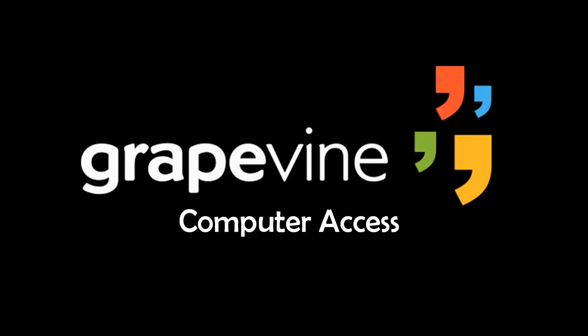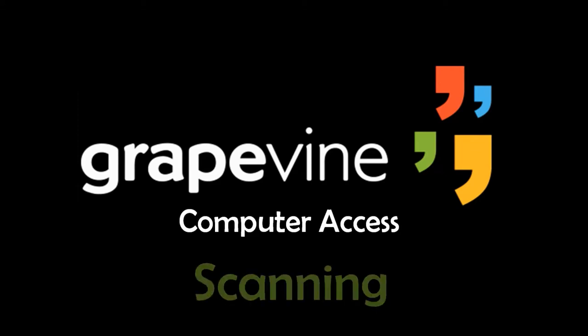This time I'll be focusing on scanning as the input method. I should mention that all features of Grapevine are available whether you're using a mouse or pointing device, or scanning using just a single button.